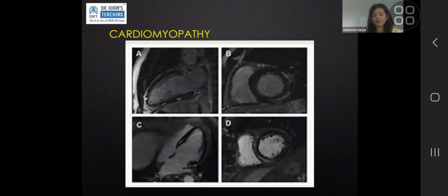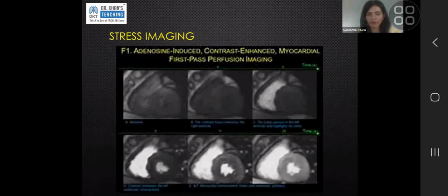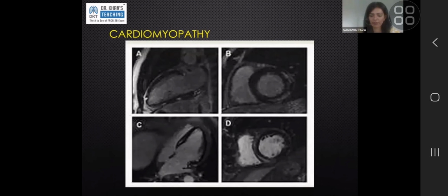Cardiomyopathy, again, if it's not ischemic cardiomyopathy, cardiac MR can very accurately tell you it's not when it is not predominantly in the subendocardial distribution. A non-ischemic cardiomyopathy sits mid-wall or even within the epicardial region of the heart. So that is the hallmark of having non-ischemic cardiomyopathy. I will go back to cardiomyopathy distribution in a bit.